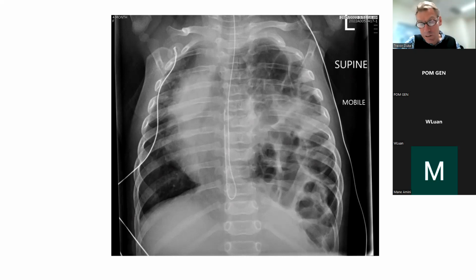And with lung hypoplasia comes pulmonary hypertension, because all the tissues of the lung are small, and that can lead to pulmonary hypertension and inadequate lungs. But if a child gets to 5 months of age and they've been relatively asymptomatic, then they must have enough lung to live, all right? It must be that they've not got severe lung hypoplasia.